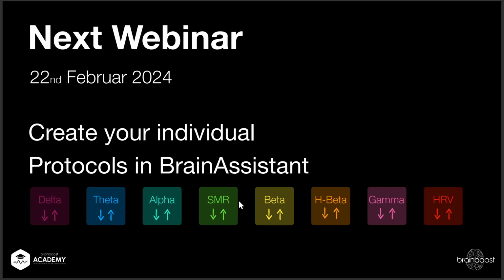So yeah, you can watch them there. It might make sense to maybe watch the last one where I explain flows generally and talk about our flows, but here you can easily create your own. Start with text, eyes open, eyes closed, text. Once you get the idea, time, skip, then it makes a lot of sense to you.